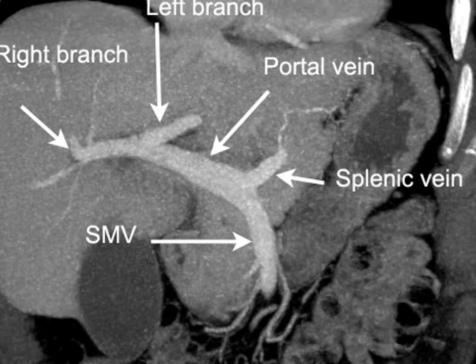We are talking about portal vein, and the portal vein is demonstrated. If you want to be more specific, portal venous phase. Even more specific.